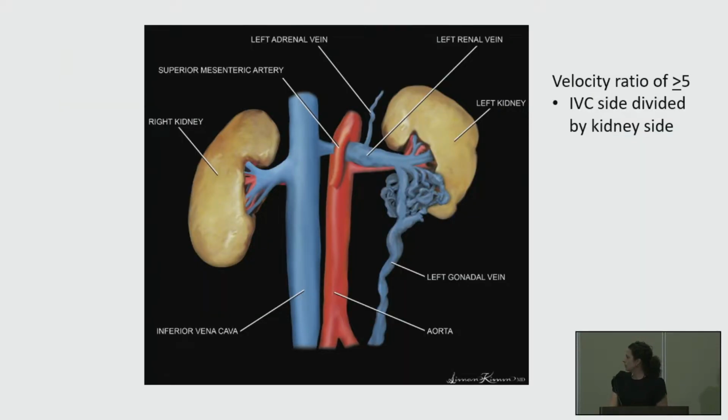So now we're transitioning into the ultrasound diagnosing these obstructions that cause these varicose veins to get engorged. One of the areas we're first going to start looking at is the left renal vein. The left renal vein gives rise to the left gonadal vein, as you can see towards the bottom part of that picture. What we're looking for is what narrowing, if any, is present of the proximal left renal vein.